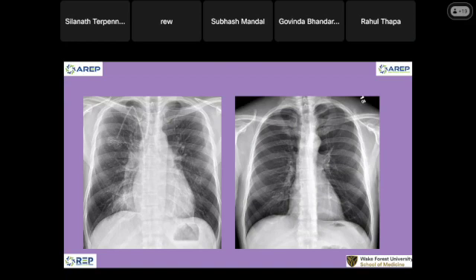Okay, let's go back to the normal case. This is my normal stomach. In this one we can just tell this person is in an upright position here. This is near normal, with normal air in the stomach. Memorize this chest radiograph. Okay. What else do we see? I'm going to go to this case.